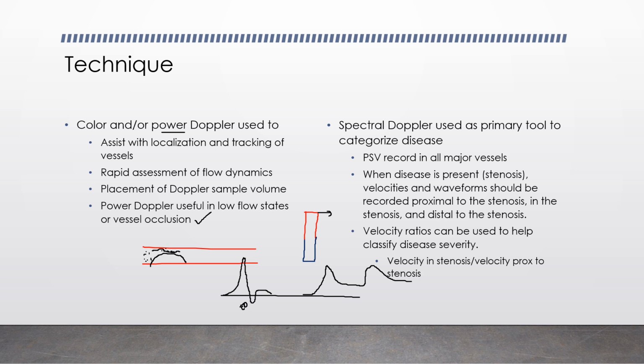So you'll see forward motion in systole, and then in diastole throughout the whole diastolic time here, you're going to see forward motions because those arterioles that are feeding the muscle cells are going to be dilated and allowing that blood flow to easily flow through, not providing any resistance, which would reverse the flow. So this is what I would expect to see from somebody that has a very normal flow after exercise.